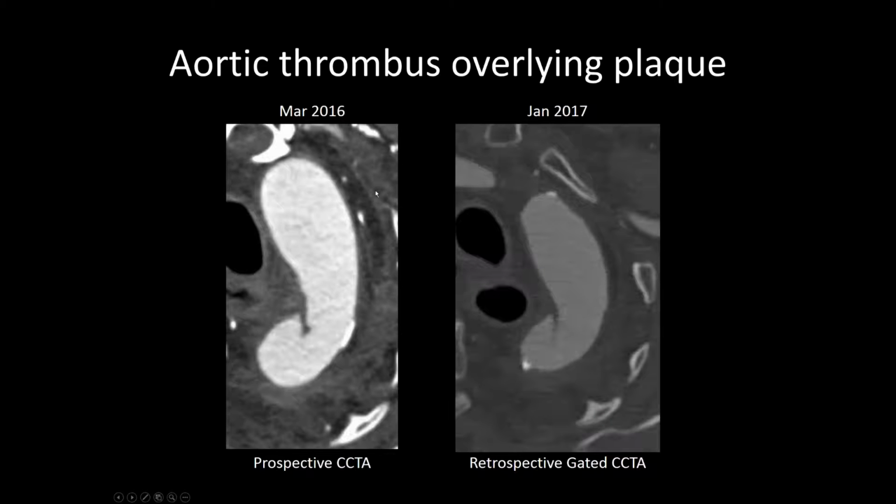And then we looked at the aorta again and just compared it in our new study compared to the old study. So again, you can see here, this is a still image. This is all the information that you can get out from the prospective CCTA, a still image. And it looks like a lesion which has some component. And here you actually see a movie.